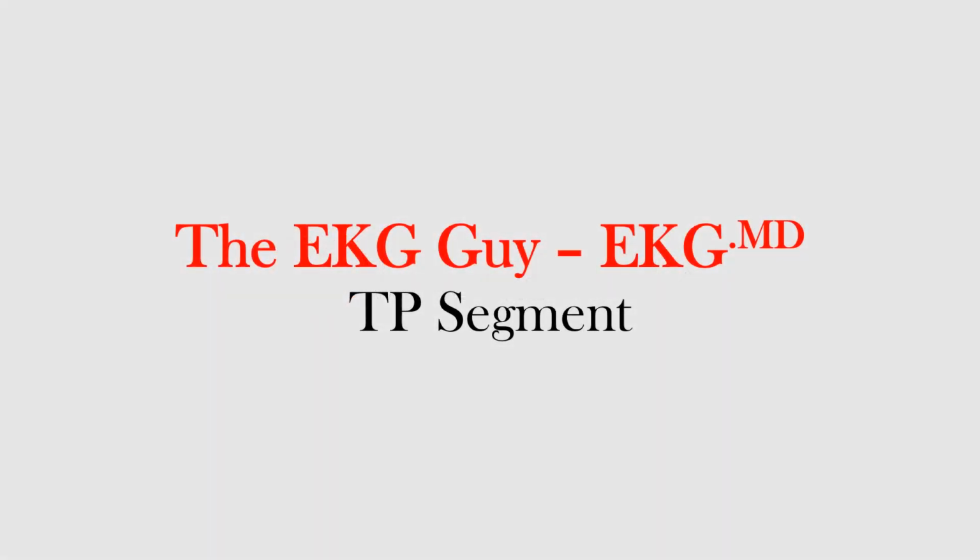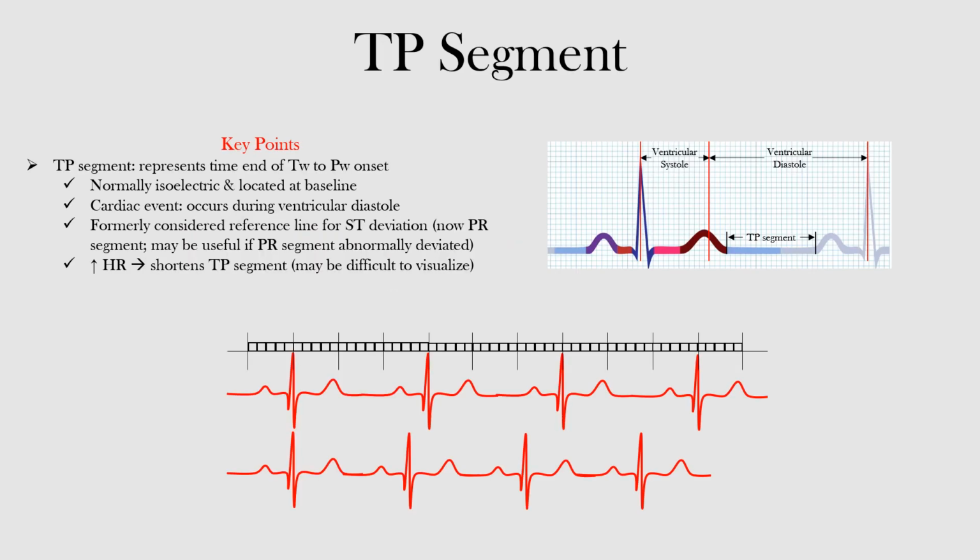In this lecture, we will discuss the TP segment, specifically what it represents and how it should normally appear on the EKG. The TP segment represents the time from the end of the T wave to the start of the next P wave. So if you look here, we can see our TP segment, okay?